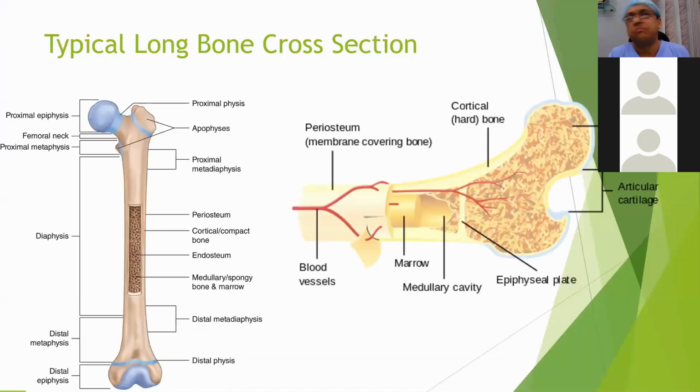So overview, again, a typical long bone, you all know, I understand. Follow my mouse or cursor to what I am saying. That will actually help you hear me out, see the content, and try to register it in your gray cells. All right, so over here is basically a long bone, a generic long bone.